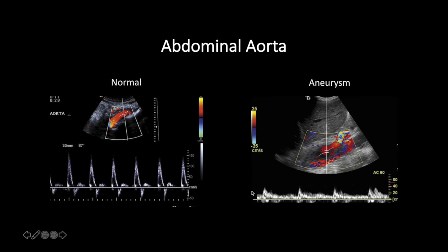So this is an example of an aneurysm with atherosclerotic disease. And when you have an aneurysm and you interrogate in the aneurysm itself, you end up getting turbulent flow. So look how thick the waveform is here. So at any given time, there's a broad range of velocities. So this is what spectral broadening looks like due to the turbulent flow in an aneurysm, for example.